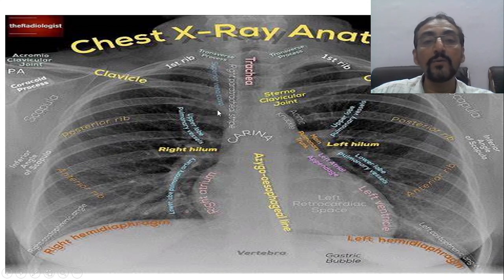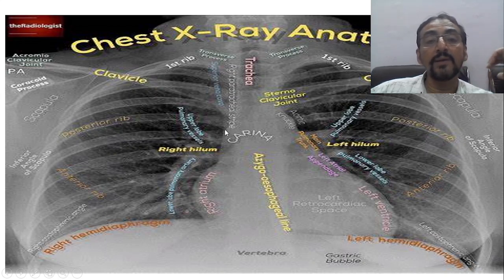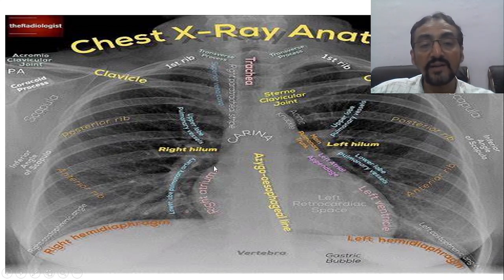Just below the superior vena cava we know that there is the azygous vein. Now we shall see whether the azygous vein is present. It is not denoted in this image, but it will be present somewhere over here. After the azygous vein, this is the portion of the aorta, the straight line seen here. After the aorta, the dome that comes is the right atrium.